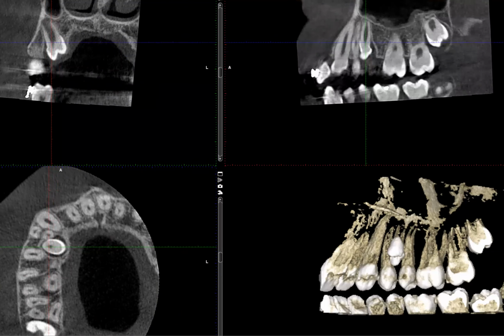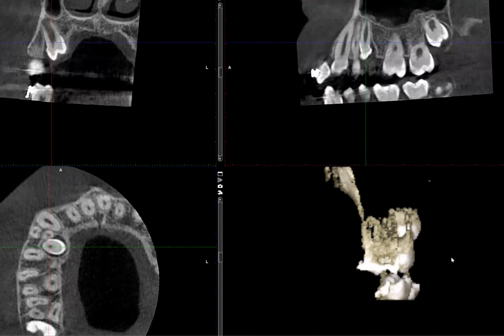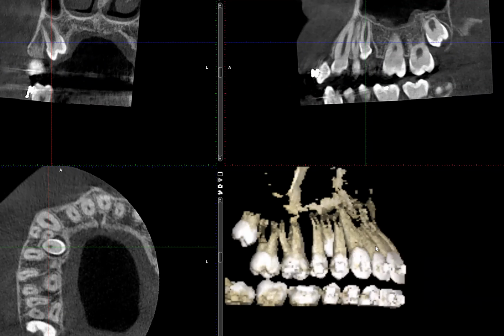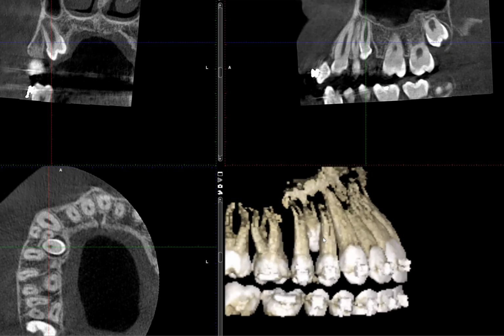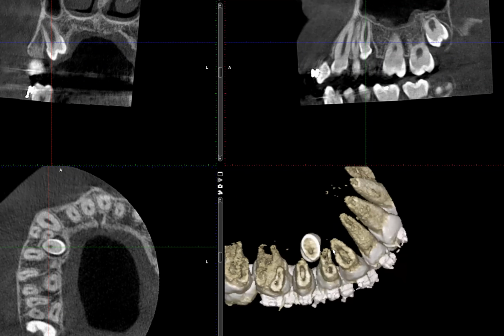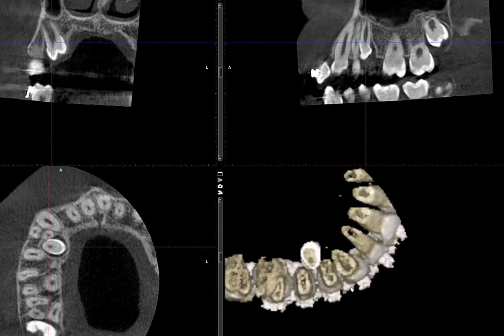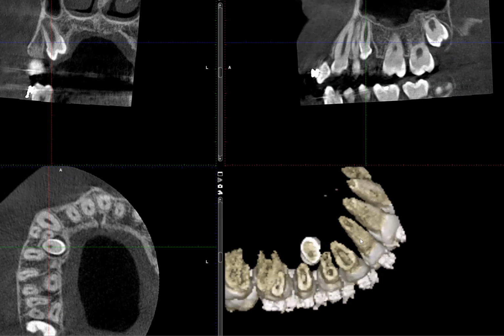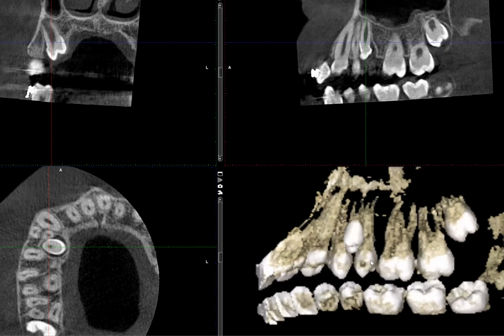Well, let's now finish the case by looking at this in three-dimensional view or three-dimensional rendering. So again, 4 and 5, and this patient is going through orthodontic therapy. And there's that extra tooth palatal to 4 and 5. Here's a superior view of how they're located. And let's take a look at this from the lingual side as well.